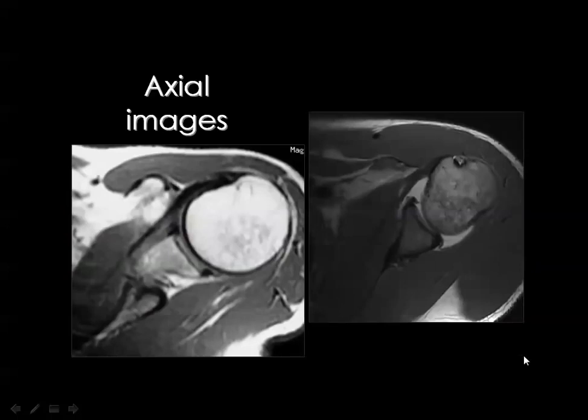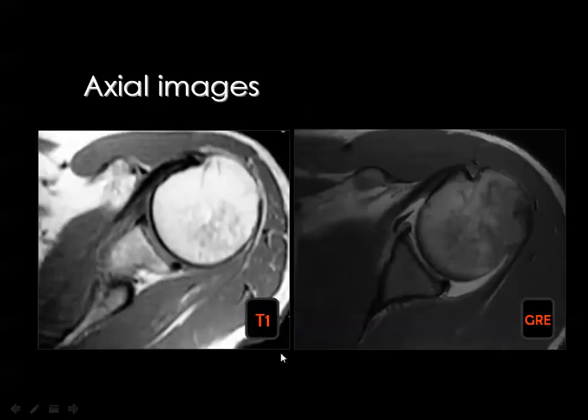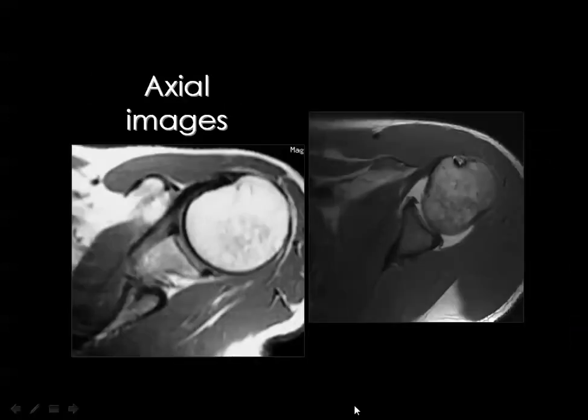If you go back to this image, you can see nicely the middle glenohumeral ligament. This is the subscapularis tendon, and this is the anterior labrum, and the ligament is present in between, as you can see.